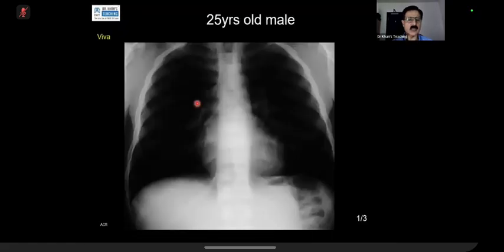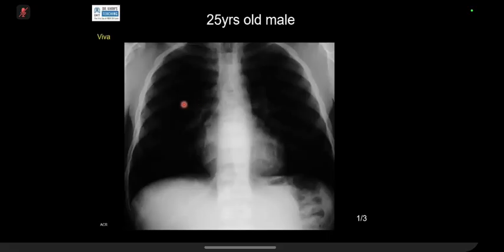Now, this is candidate one, spot diagnosis. What's happening? Give me the description of the spine. This is H-shaped vertebra. Diffuse H-shaped vertebra of most of the visualized dorsal spine.